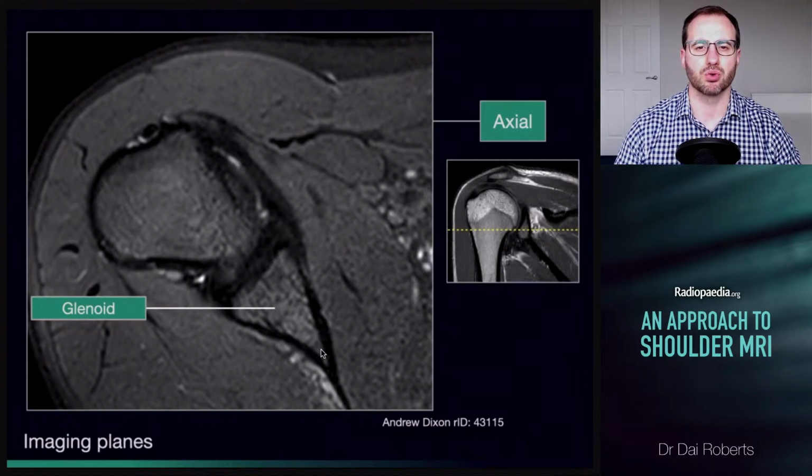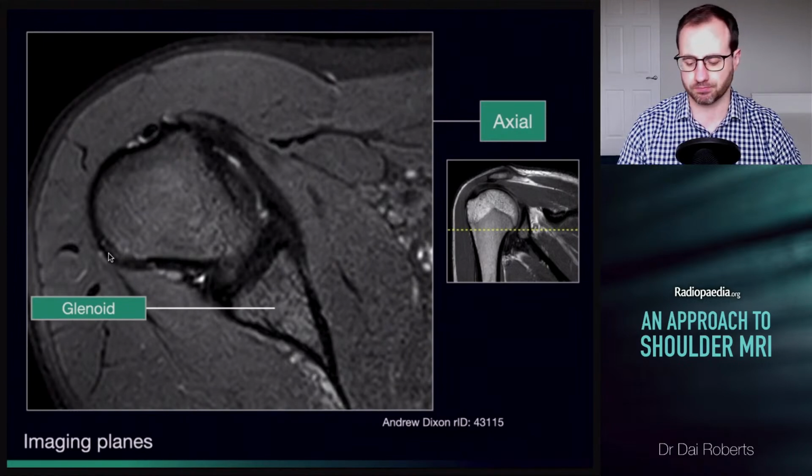On all of our shoulders, really get a little image bank of what a normal glenoid looks like, and again, if you know your anatomy, it'll really help you understand what abnormal looks like. Nice sharp contours, and there's no previous or current bony Bankart. Again, we see the proximal long head of biceps tendon, a bit of subscap, and there's probably a little bit of infraspinatus here.